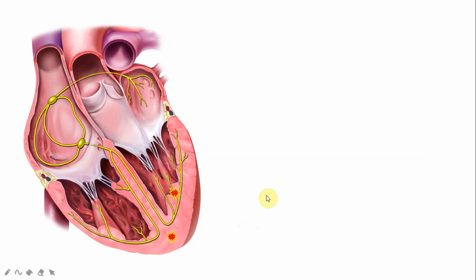Now, what is that atrioventricular dissociation? As you can see here, the atria is doing its job generating the cardiac impulse, and in the ECG there will be some P wave. However, the ventricle is generating cardiac impulse at a very fast rate, so predominantly you will see some wide complex tachycardia. You may not see the atrial activity at all unless you do some Lewis leads or something else.